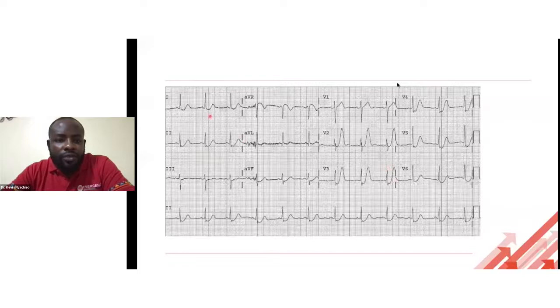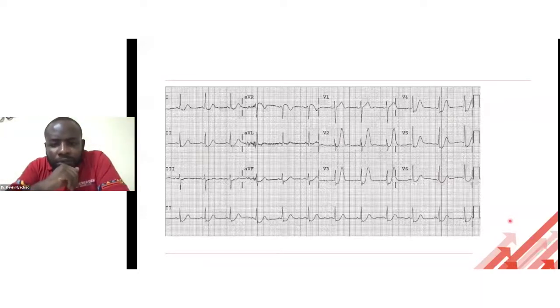So, the other STEMI equivalent. Okay. So what are you guys seeing here? 50-year-old patient, chest pain, they are diaphoretic, pain radiating to the left arm. They're saying they're not able to breathe, they're hypertensive, they're dyslipidemic. What are you guys seeing here? And what do you think this is? Okay. Somebody is saying peaked T waves, which are symmetrical. Okay. I agree. Some peaked T waves here.